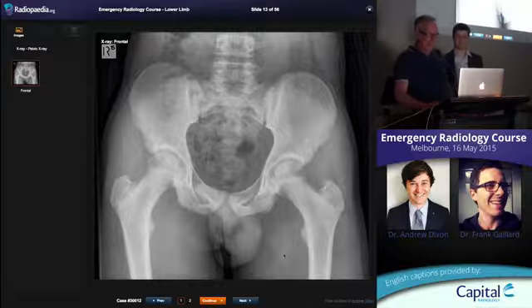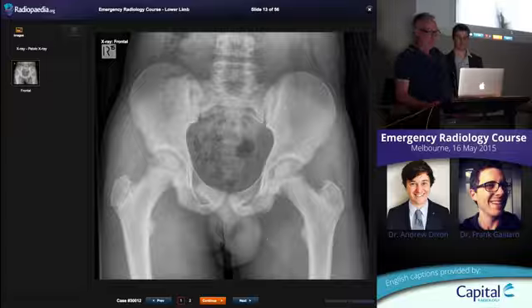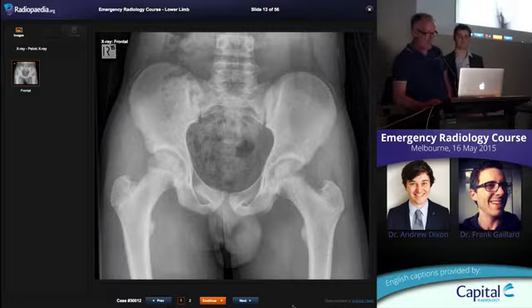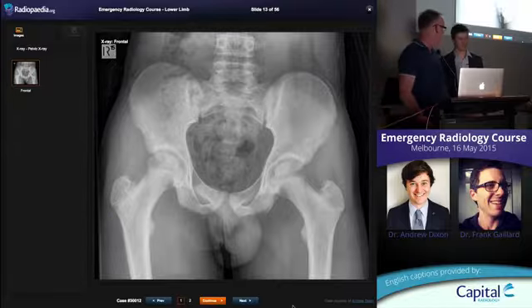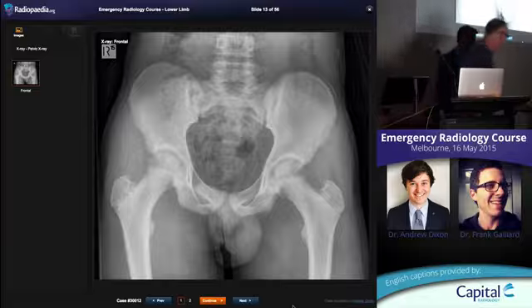So we've got an avulsion fracture of the ischial tuberosity here. Correct. It's a classic fracture in kids, soccer kids especially. It is almost always a 14-year-old boy playing soccer for these ones. So get yourself a bottle of wine or some food.